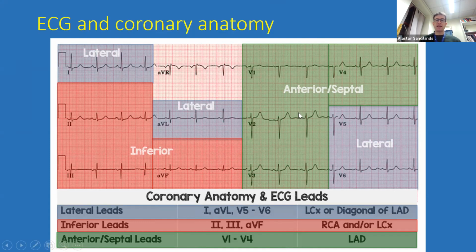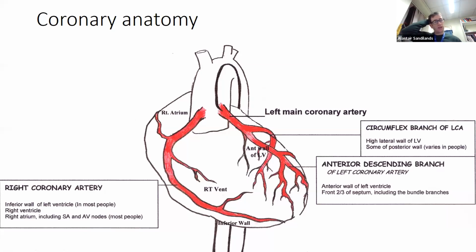So not forgetting again that if you have ST depression in the anterior leads only, I'll show you an example. Remember to do a posterior lead V7, 8, and 9. So again, we've got to think about things in 3 dimensions and sort of overlay that with the ECG at the same time. We're trying to look at the arteries, where they're traveling and what they are supplying.